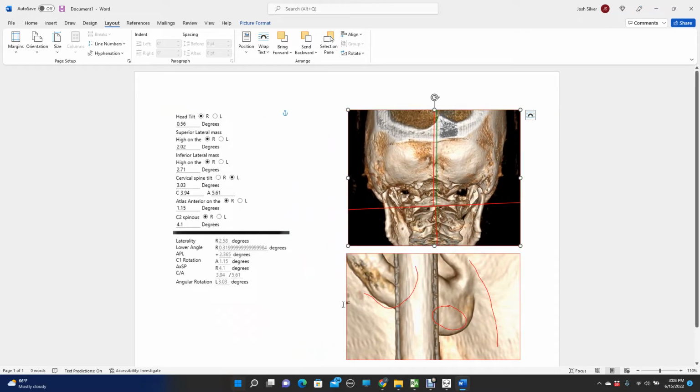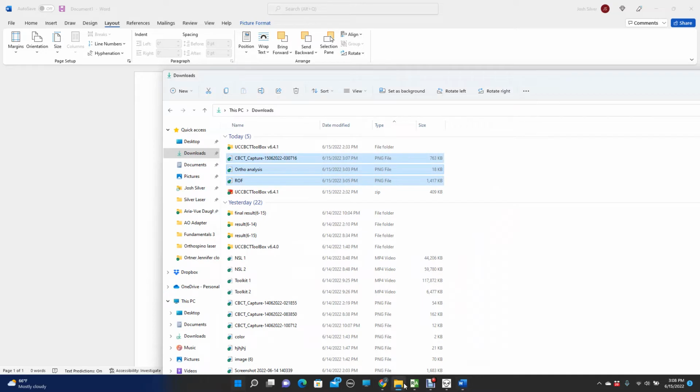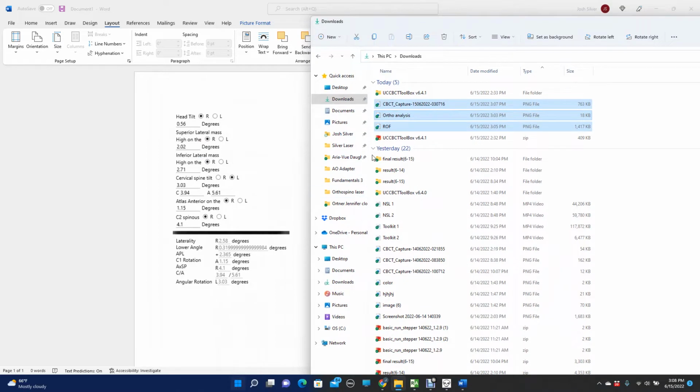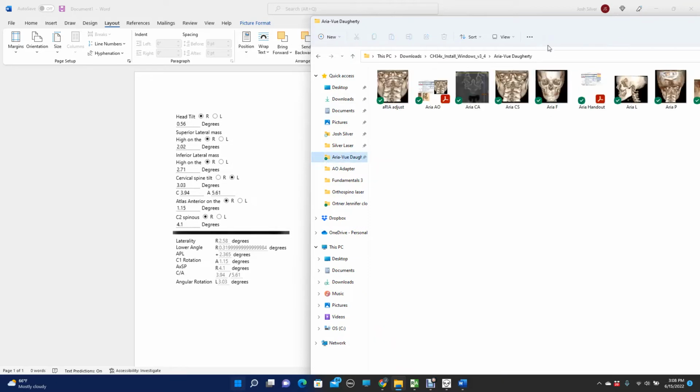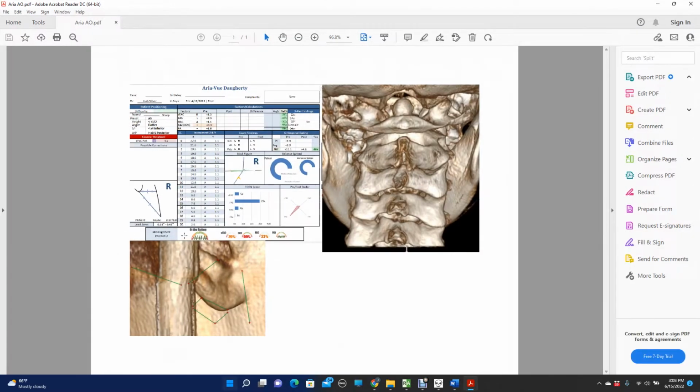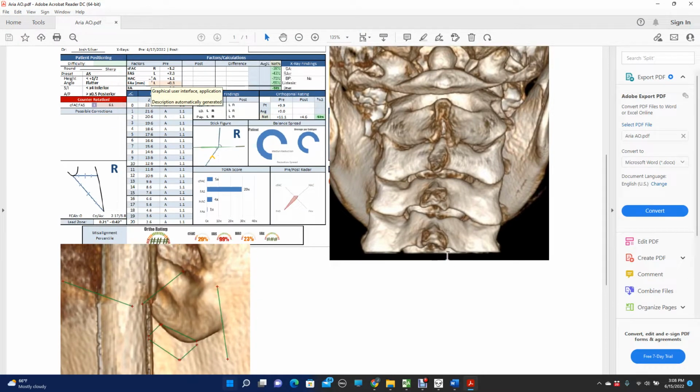Now for me, I actually use Sonus Blueprint, and that document will calculate all of my vectors. So you see I've got all my measurements here, but when I'm adjusting people, this is the listing card I'm using. It will take all of my measurements and automatically pop them in and calculate the Z and Y of my adjustment and give me some reference of how bad they are compared to other patients I've seen, exactly what type of positioning would be best suited traditionally for a case like this. There's my mastoid and my posterior view.